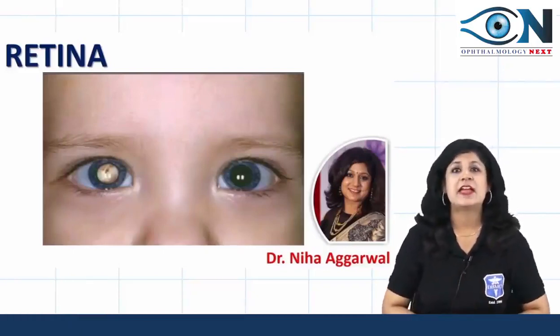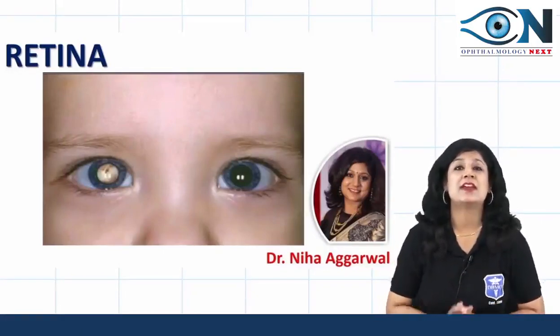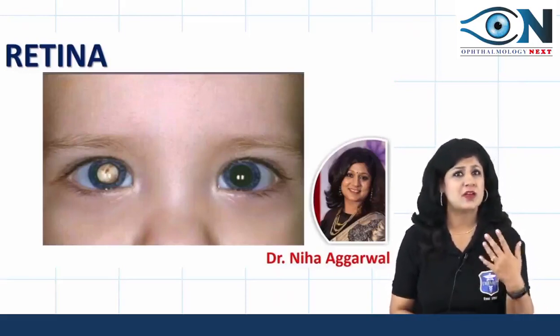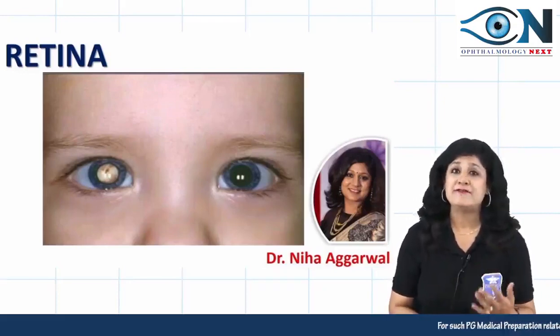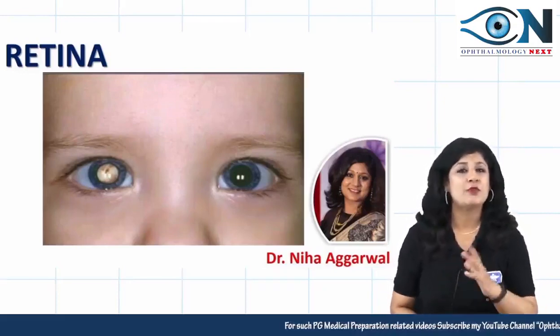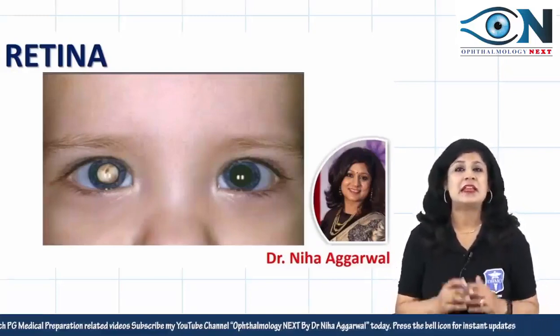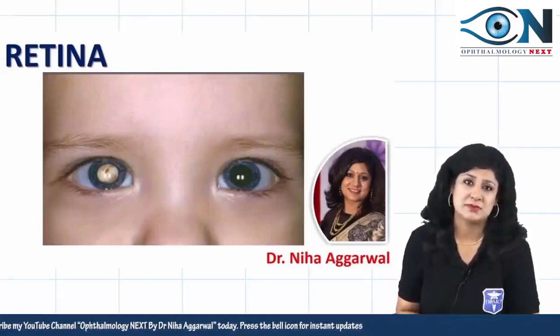As I always get so many messages regarding the discussion of fundus images and retina images, because they are often asked, very important, very high yielding, and often there is some confusion regarding the fundus images. So let us begin with the fundus images today.